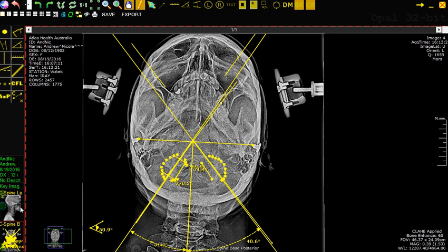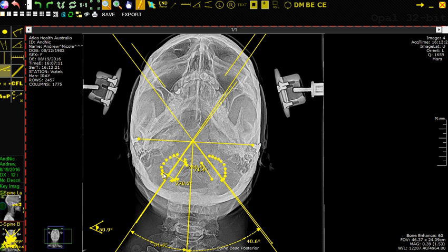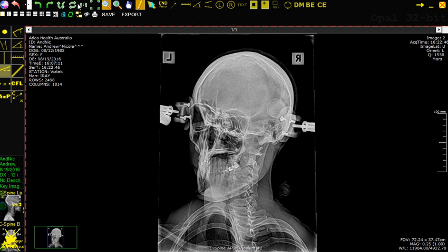Just to show you what also happens ultimately, we use this x-ray and then we also do a simple measurement on this one. It does vary a little bit, but we basically use the normal angle measurement tool with respect to gravity. We would take an x-ray at this angle, which is usually about 10 to 15 degrees, so that's pretty average, but we would take the next x-rays at this 31 and at this 40 degrees, and we would come up with an x-ray that looks like this.